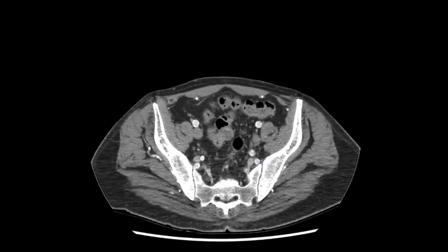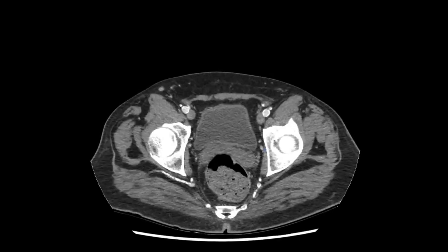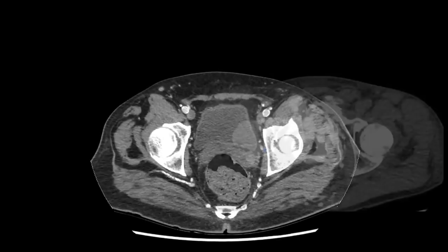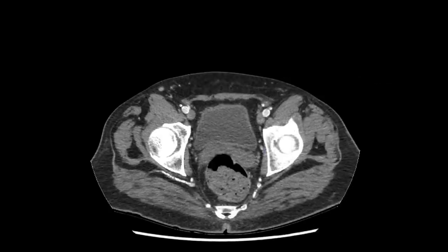The reason why this anatomy is important, there are many clinical reasons. One clinical example, we've put up a picture over here. This is a patient who had pelvic fractures and hematuria or blood in the patient's urine. And this is what is called a CT cystogram. Patients who have abdominal trauma or pelvic trauma with pelvic fractures and hematuria, the first thing you need to think about or rule out is a rupture of the bladder.